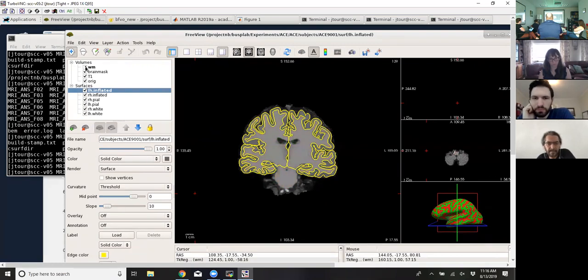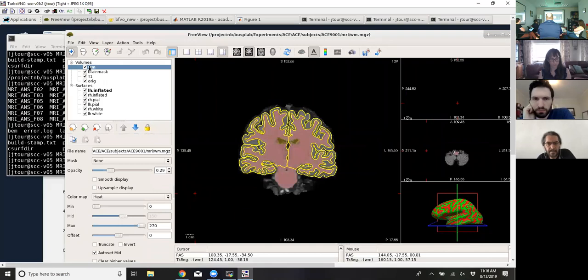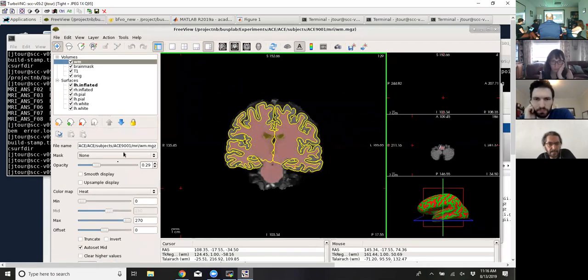You also see that there's a list of information, so you can do some settings here. If I click on it, the check means it's going to be viewable in the window in whatever position it's in. This highlighted bar means that it's the image of the file that is actually being addressed by these controls here, which is a huge pain in the butt.